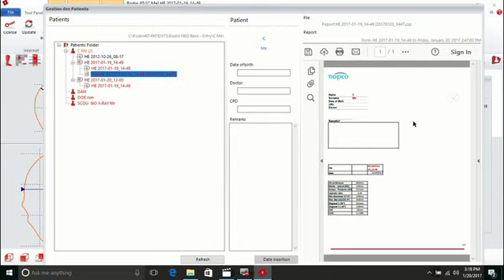So your other options are, from here you can print by clicking on your print icon. Sometimes these are located at the top of the window here, or if they're not there, take your cursor and hover it over the top of the page and the bottom of the page, and that will generally bring up the printing and saving. So click the print icon if you have a printer attached. If you want to save it to email at a later date, click on Save.